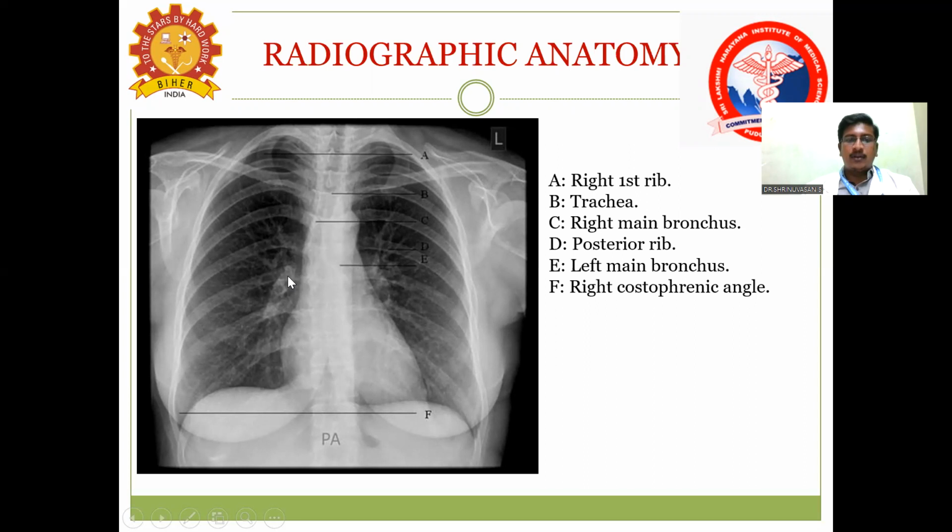So you can see the right bronchus here, left bronchus here, and here you can see the superior pulmonary vein and inferior pulmonary artery, which together with the bronchus and lymph nodes form the right hilum, and here the same thing forms the left hilum. The central white structure is called the heart, and the other 2 air-filled structures are called the lungs.